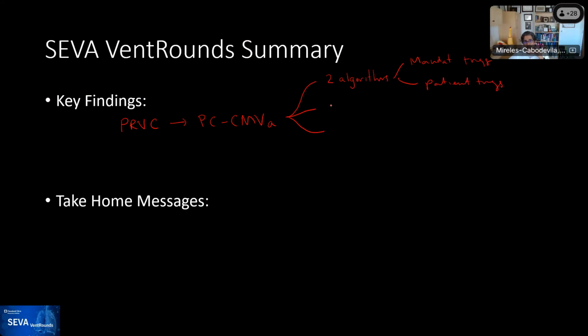We also recognized the 1.5 BT rule that will make it cycle earlier than what you would be looking for. And then we talked about early trigger as a cause of multiple trigger. And we demonstrated that with the different phenotypes of reverse trigger that were occurring here.